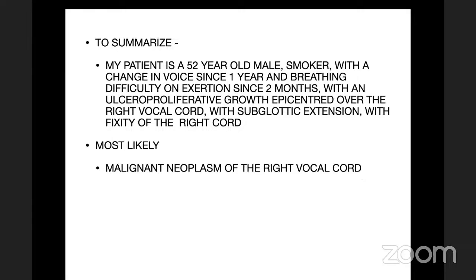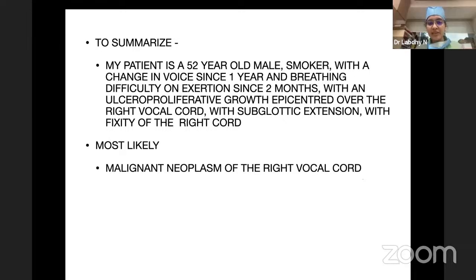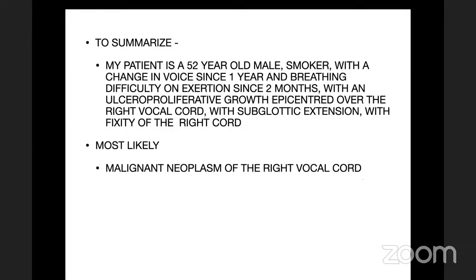So what are the CT criteria for cartilage involvement? We look for whether there is any sclerosis or lysis or erosion or transcartilaginous spread, or extralaryngeal spread. Which among these is most sensitive?